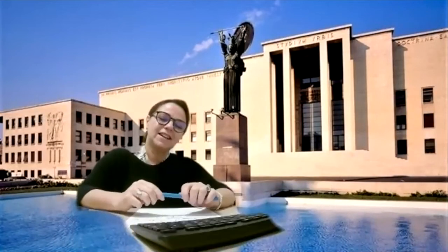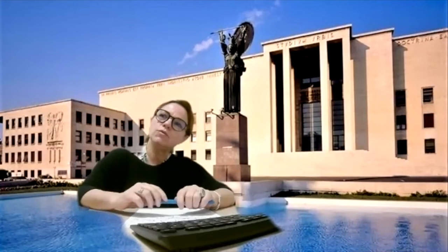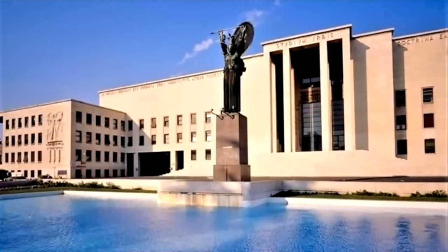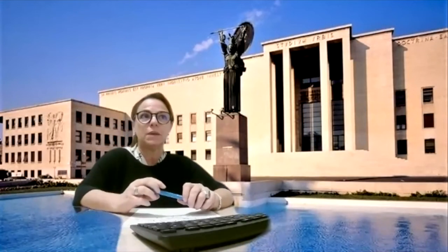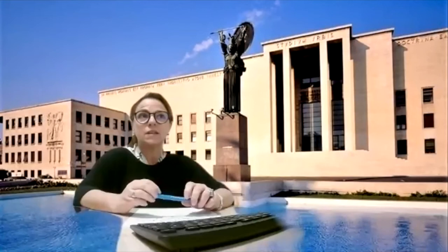Okay. So recently a new scoring, PIRR, has been published in order to report local recurrence after radiation therapy and radical prostatectomy. It was an international consensus from a panel of experts.